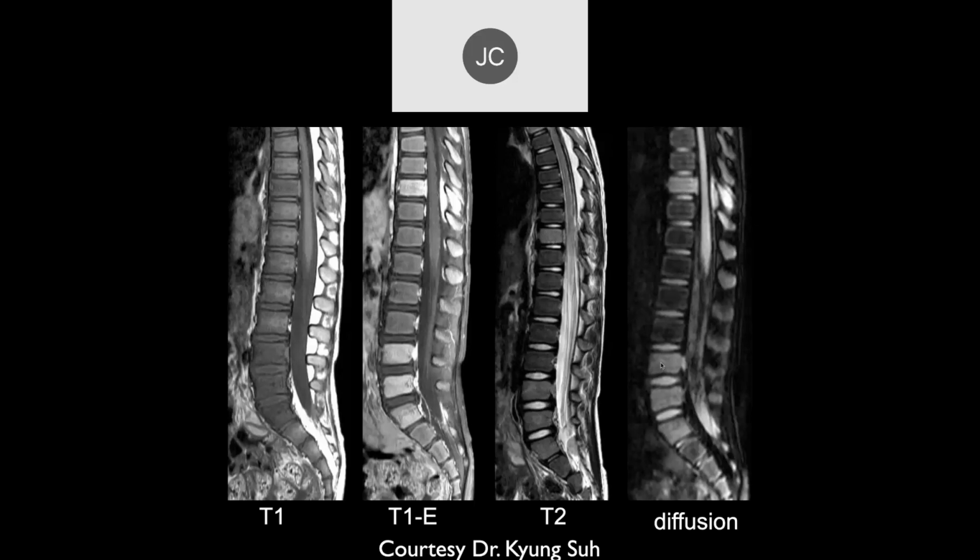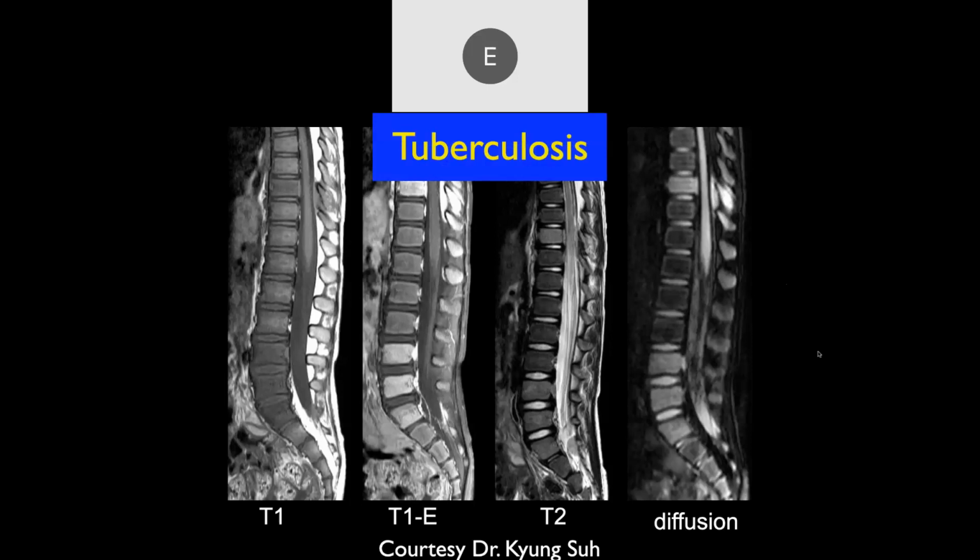And then the diffusion weighted images also show you've got edema within the bones there. So what's your diagnosis? And then we've got a posterior element involved here, a little bit of probably an extradural abscess there. Extradural abscess. Yeah, I'm still worried about infection. Yeah, well, it's TB.